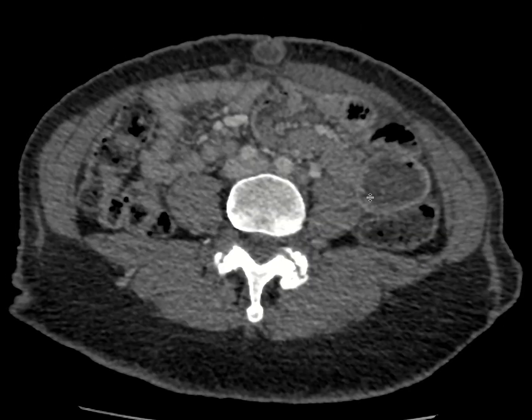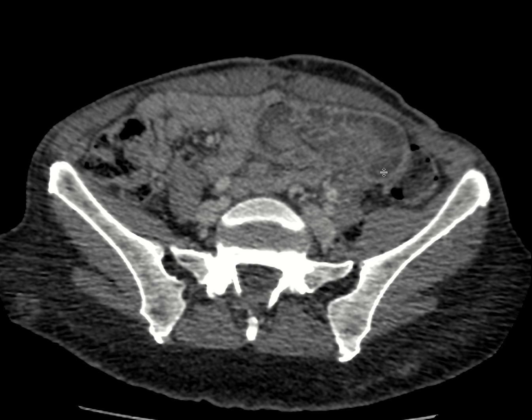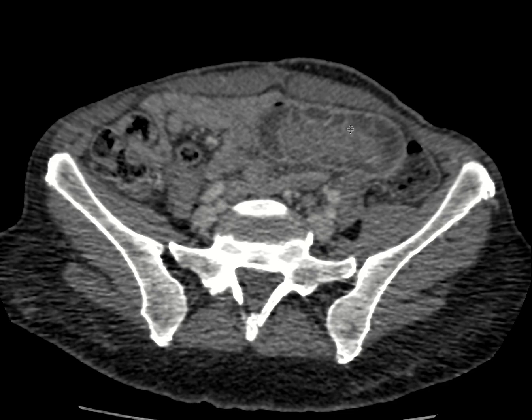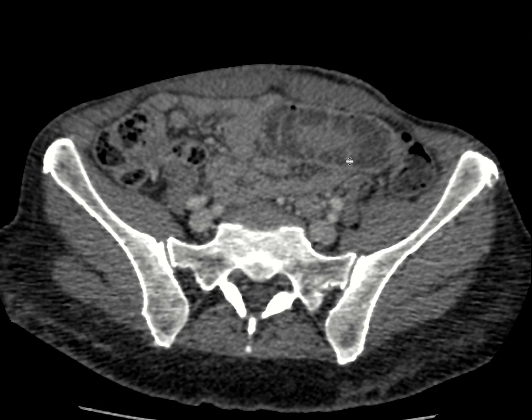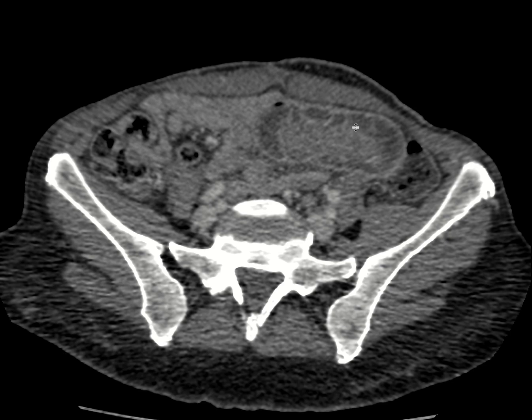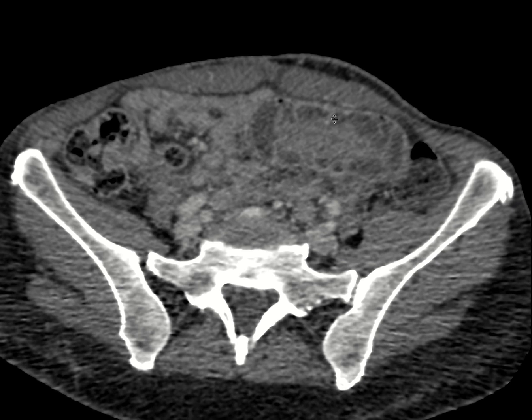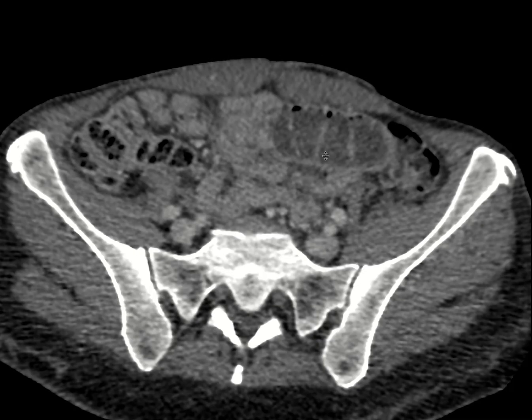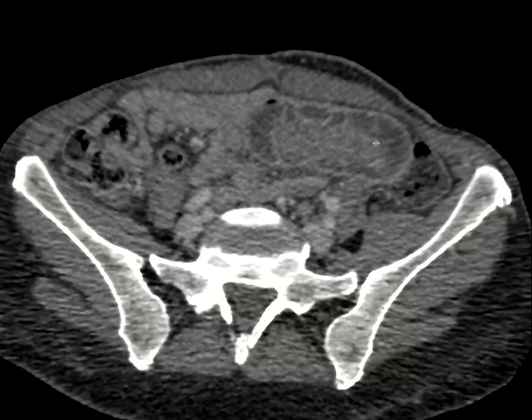But in a patient who's having abdominal pain, if we look a little further, more distally in the jejunum, we can see that there is mass-like thickening of the jejunum right here. Now, the question then becomes, what's causing this? We can see here the plicae circularis, also called the valvulae conniventes. That's these kind of linear luminal excrescences into the lumen of the small bowel of the jejunum.